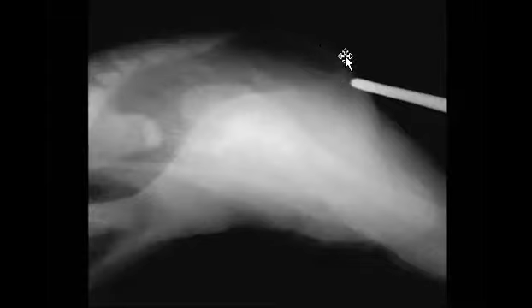So you can think about anorectal malformation. And you can see that he tried, in this age, if you think about it, imperforate anus. So imperforate anus is one of the low obstruction patterns that you search for.